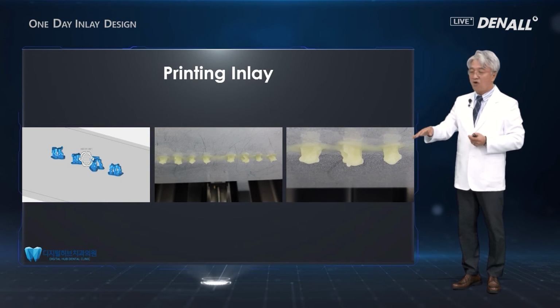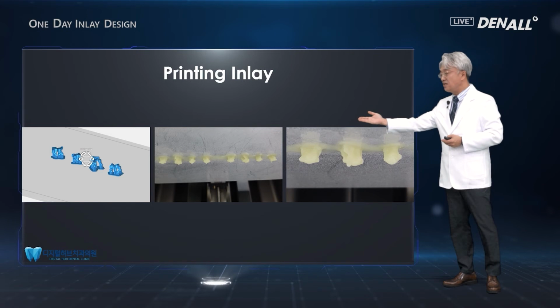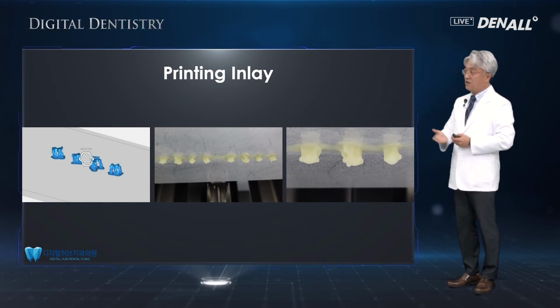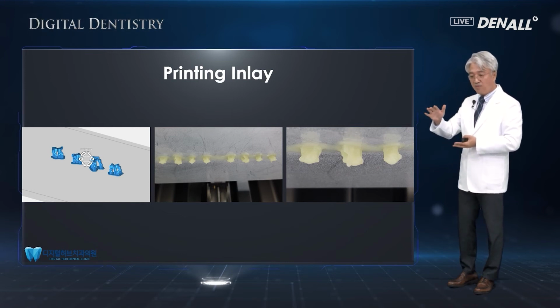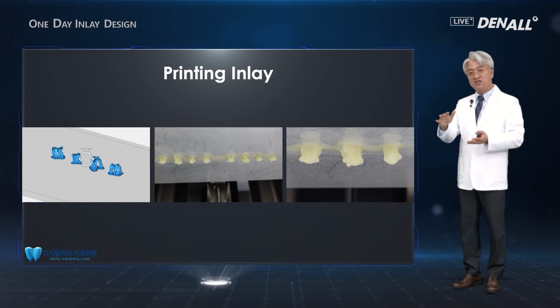So you put that in the 3D plate, then print, then the next two pictures are just right after printing. If you see the enlarged image, the two shapes are quite good. And now 5 or less than 15 micron, that precision level is now possible. So technically, there's not much of a problem anymore.